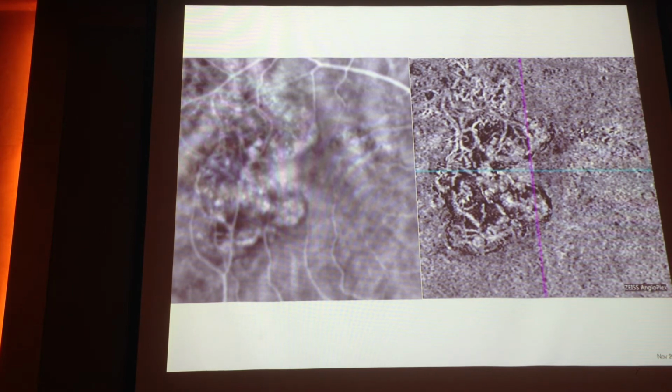You don't see completely all the bulge, but some of those are evident. Even if we saw it, the filling was very slow. So it's difficult to say what we can see and what we cannot see.